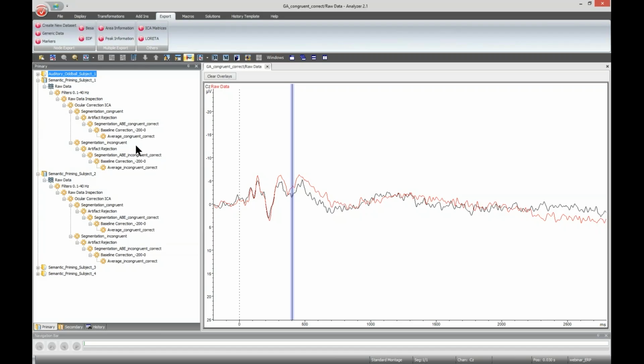So I also do not have the same number of trials in here, just because of the processing I did. Also, it's not possible because some data might be noisier than other data sets. In the end, though, they are roughly the same. And you should probably, if they are not always the same, indicate in your publication later how many trials went into each condition. This is usually something that is required. Okay.